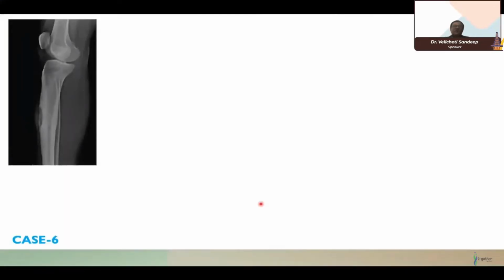The last case is a sports person, a university student coming from the US, who was playing football, and there is some blister-like lesion in the anterior part. This presented immediately after the trauma. They thought this could be a subperiosteal hematoma causing burrowing. Let us give it some time and see what happens, because this is immediately after the football hit. There is subtle sclerosis in the medulla.